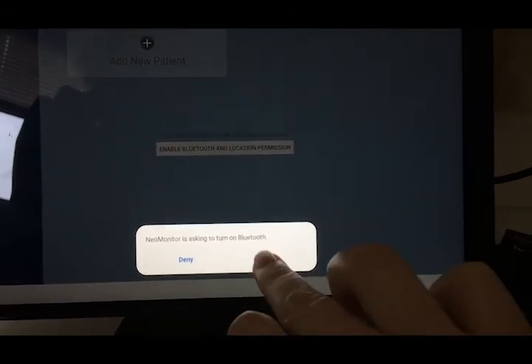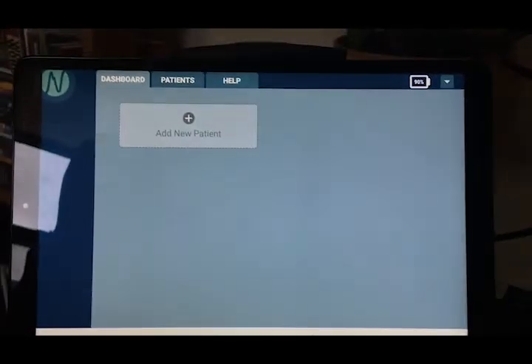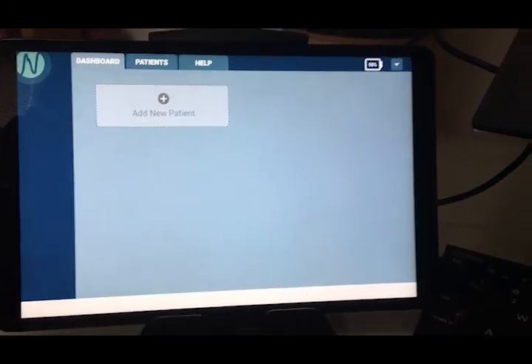It is going to open the app here and ask me to turn on Bluetooth, which we must allow, and ask to access location. We will tap allow. So now this app is fully set up and in the locked admin mode. We'll notice that it's at the bottom of the screen here. There's no home button.